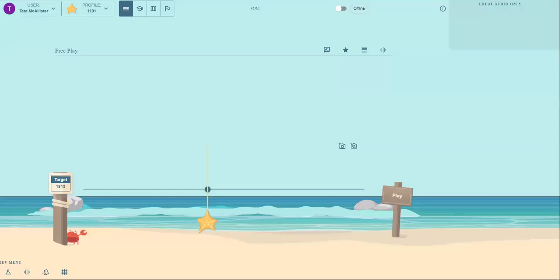Hi, this is a demonstration of the staRt application for visual-acoustic biofeedback. staRt is a tool intended for speech pathologists to help children with speech-sound disorder learn new speech skills.